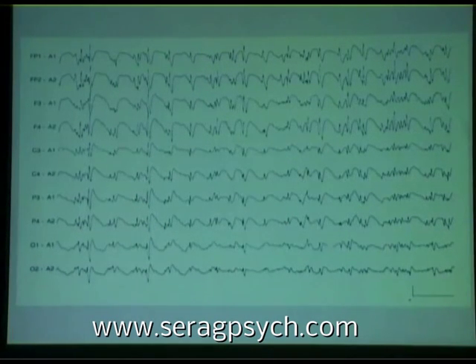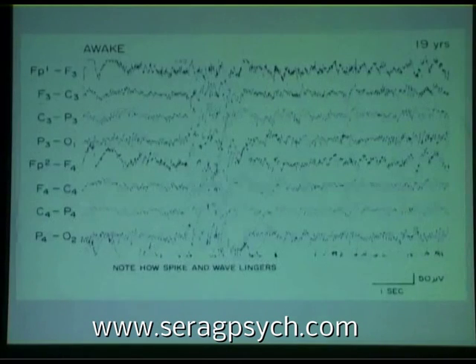Why elderly people can suddenly go into absence status, very rarely, without a previous medication or seizure history, is mysterious, but this is what you might see. So next, please. I don't think we can, no, that's too poor quality, I'm sorry.